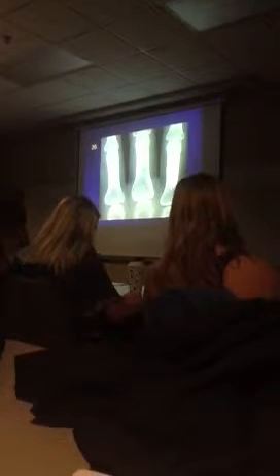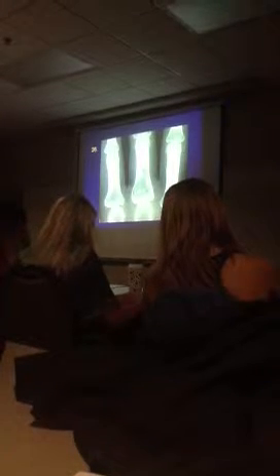Same thing with the unicameral bone cyst and non-ossifying fibroma. You don't get a periosteal reaction. If you see one, it's either not that or there's something else wrong.